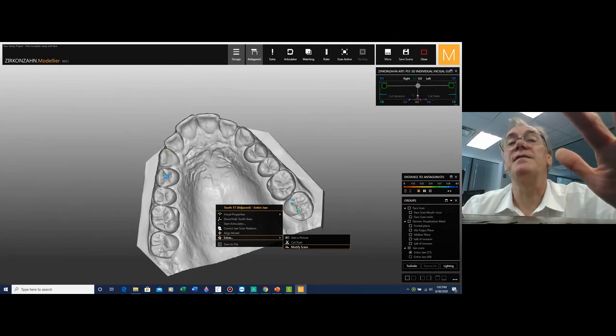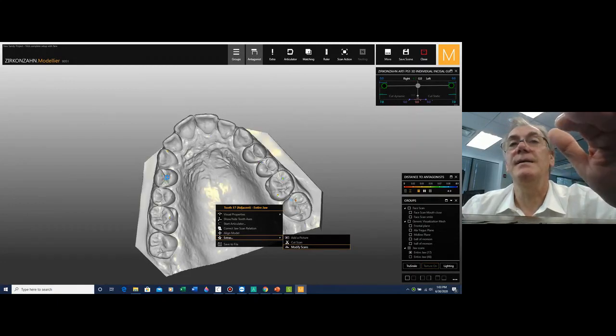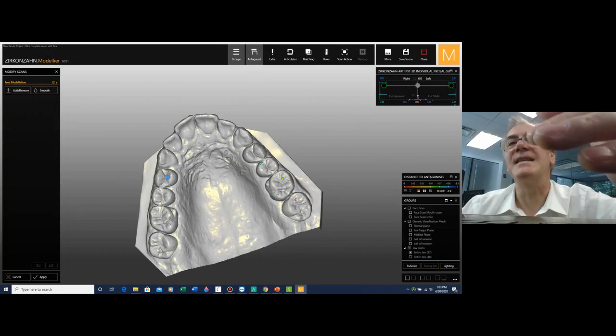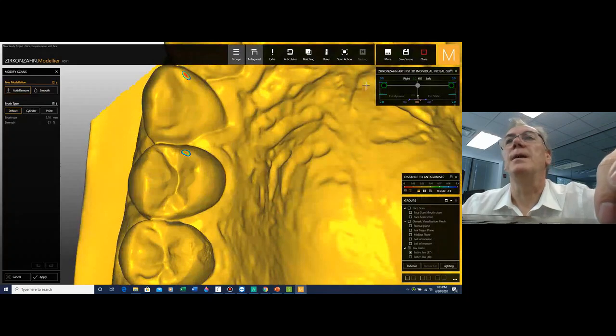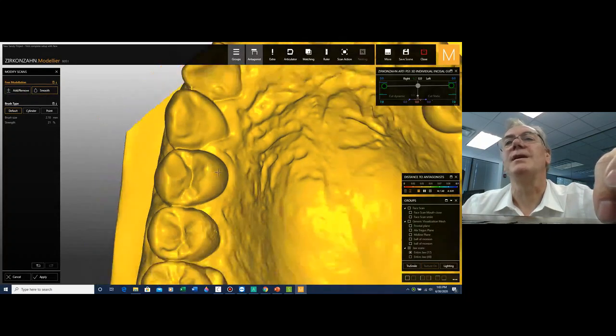This is keeping in consideration the fact that we're not touching or moving that canine. The anatomy looks pretty good. There might be something that can be modified in relation to the position. If the odontoplasty is not an exaggeration, it can be performed. If it is an exaggeration, that means that we are going to take away too much biological material. Then we have to evaluate the fact of shifting the canine in order to get a better side shift. We're going to have to take away a lot of material. So most probably an odontoplasty on this tooth is not going to work.